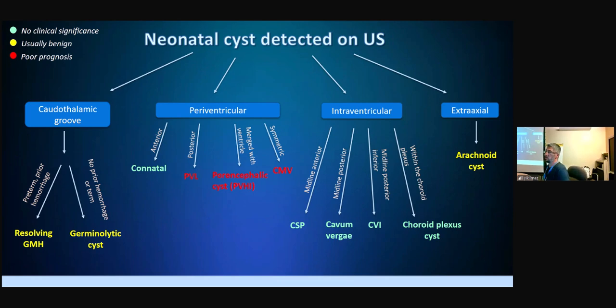Maybe frontal horn cyst, and also germinolytic cysts are called pseudo-subependymal cysts.